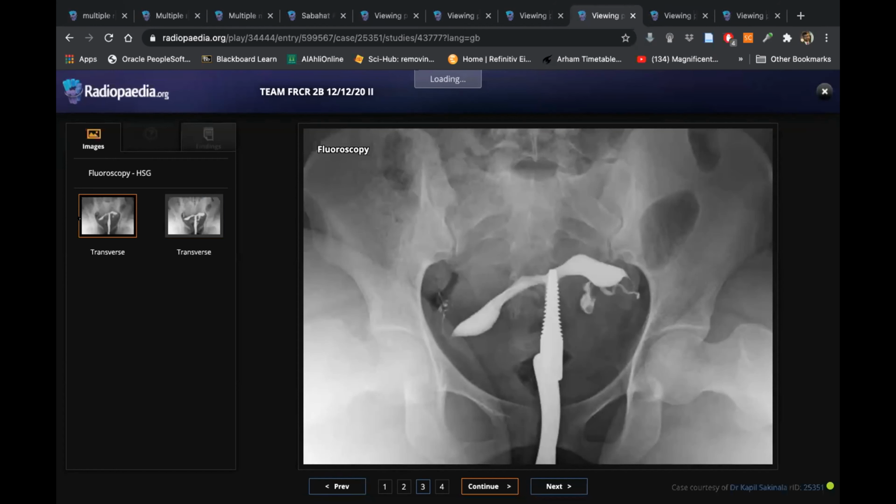So my differential would be, the possibility is bicornuate uterus. Okay, I'll give you the next case. Okay, good.